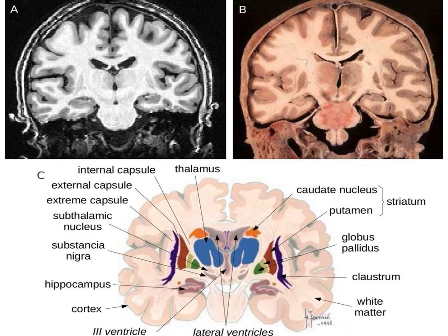Just going posterior, to the mid coronal plane, we can see here the caudate nucleus. This is the lentiform nucleus, or putamen and globus pallidus. These two structures form the striatum.